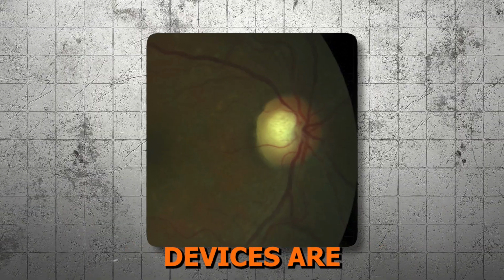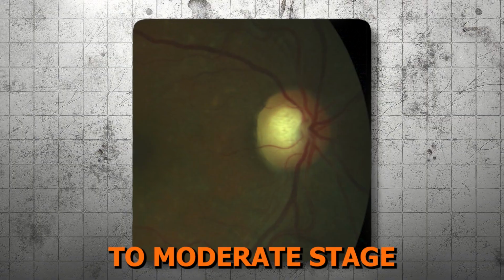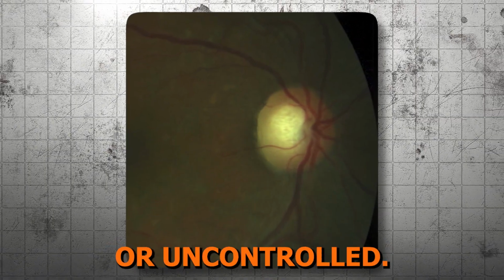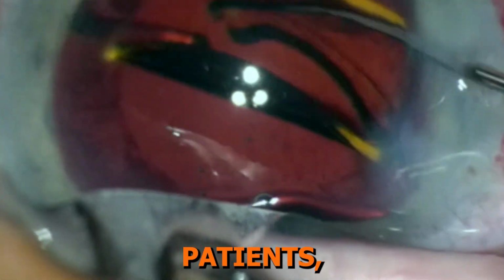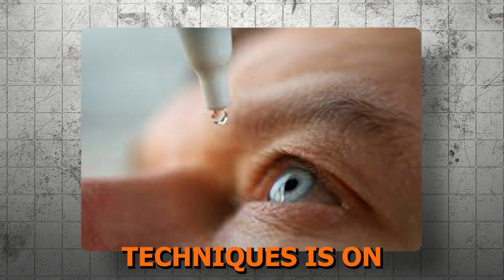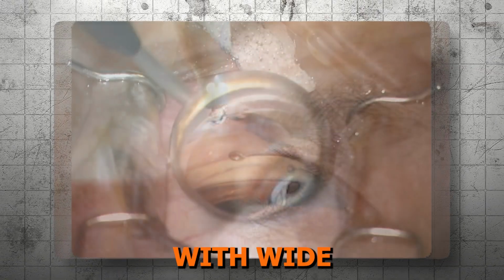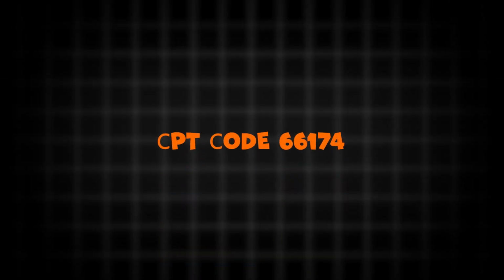All canaloplasty devices are indicated for open-angle glaucoma patients with mild to moderate stage that is controlled or uncontrolled. This can be done as a standalone in phakic or pseudophakic patients, as well as combined with cataract surgery. An ideal patient for canaloplasty techniques is on 0 to 3 medications with wide open angles on gonioscopy and a clear angle view. The CPT code for canaloplasty is 66174.